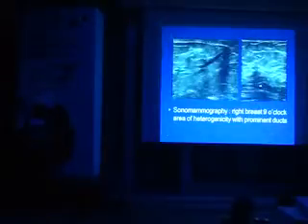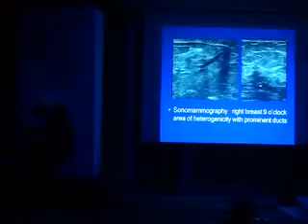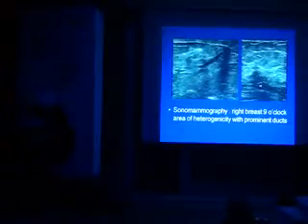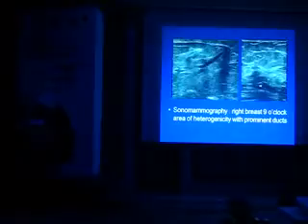Okay, the ultrasound. Sometimes we are really confronted with such cases that the mammography findings are subtle and the ultrasound findings are also subtle, despite the fact that the lady has a lump in her breast. So, the ultrasound, as it's shown here, shows the dilated duct that we saw in the mammogram, and an area of heterogeneous, borderless hypoechoic area.